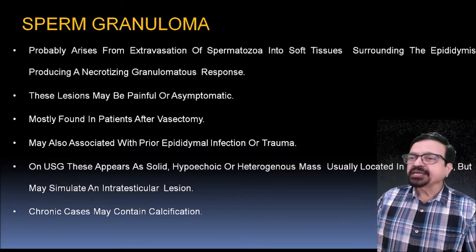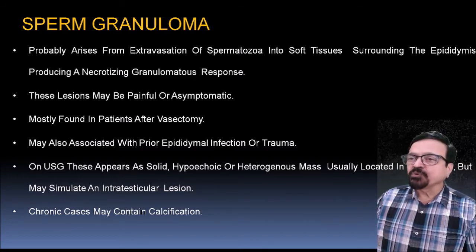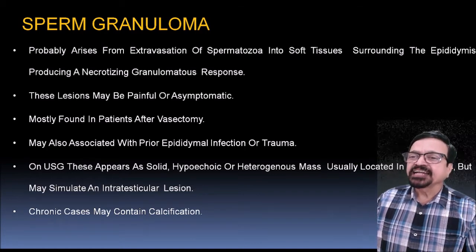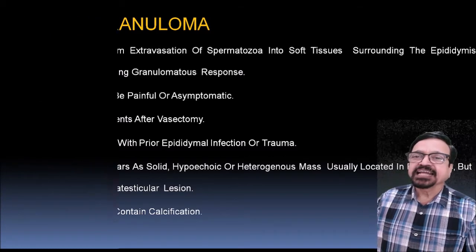On USG, this appears as a solid hypoechoic or heterogeneous mass, usually located in the epididymis but it may simulate an intratesticular lesion. Chronic cases may contain calcifications.